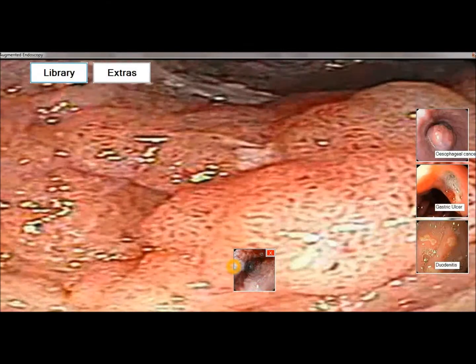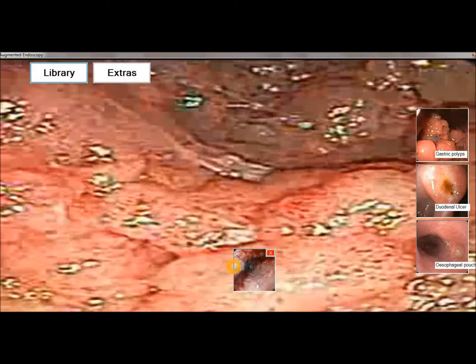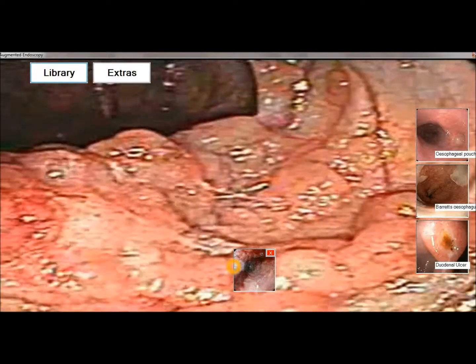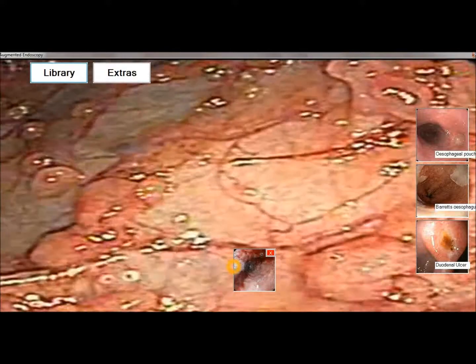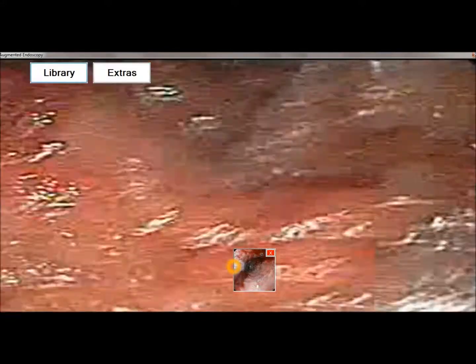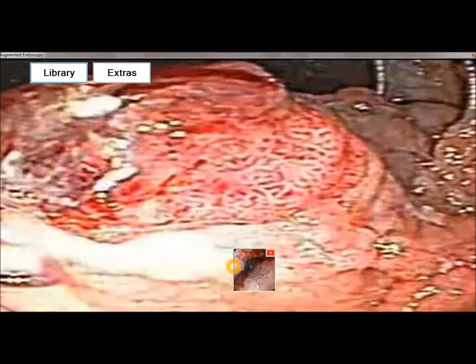What I'm going to do now is run through the 3 image processing techniques that have been used in this application. The first technique uses the color of the image. It then takes the threshold of this across 2 of the planes. So I believe it's red and green. It's been a while since I wrote the code.